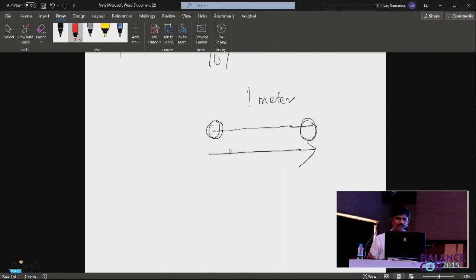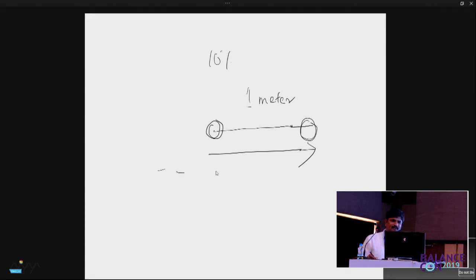We all know this is a rightward movement. So let us say this is the place on the graph. This is where the target is supposed to end. This is the first point. This line is the second point, rightwards. Is that right? You're all with me? The S should be a bigger S.